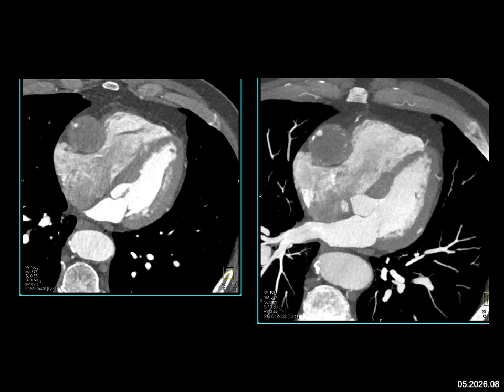It looks like whatever's there is involving the right coronary artery, but I couldn't rule out an angiosarcoma. Lymphoma usually also involves chambers of pericardium and would displace the vessel. Vasculitis, Kawasaki's, will give thickening of the vessel, but not this mass-like effect. And when you look at this, it's so nicely round.